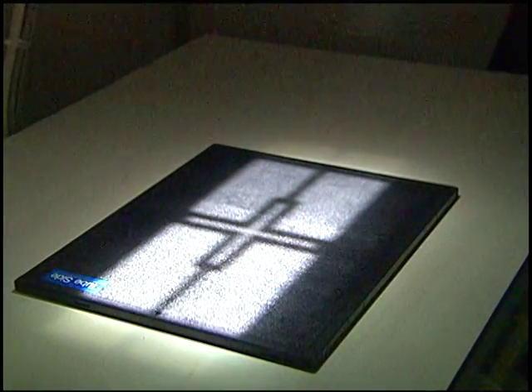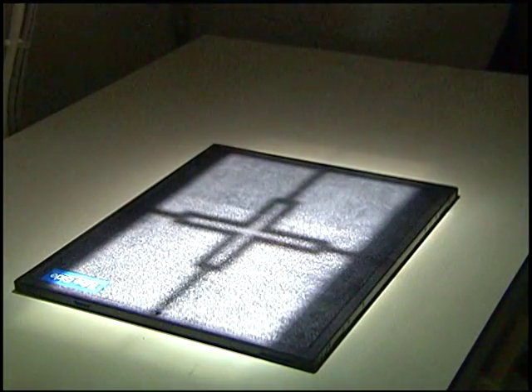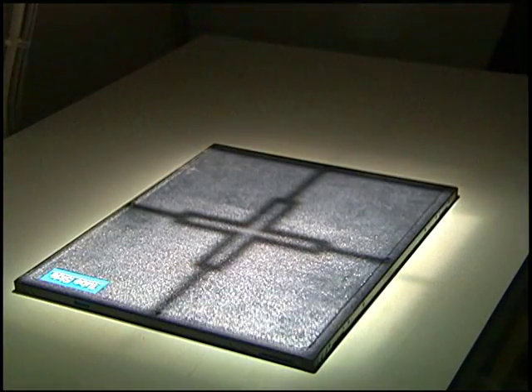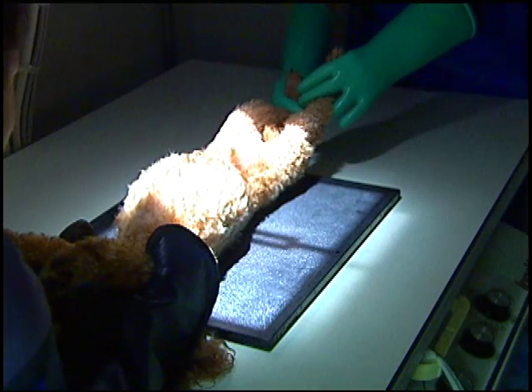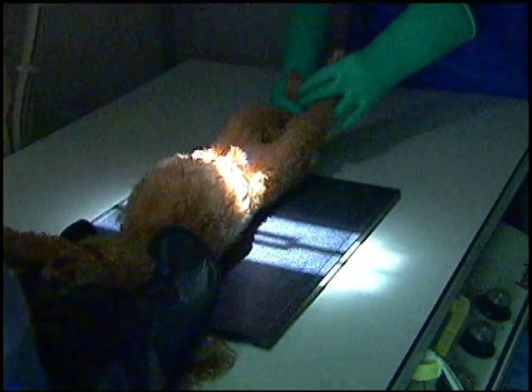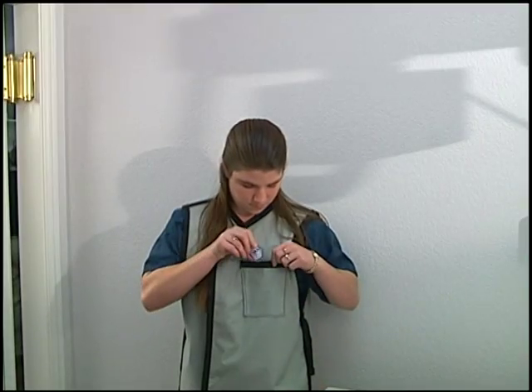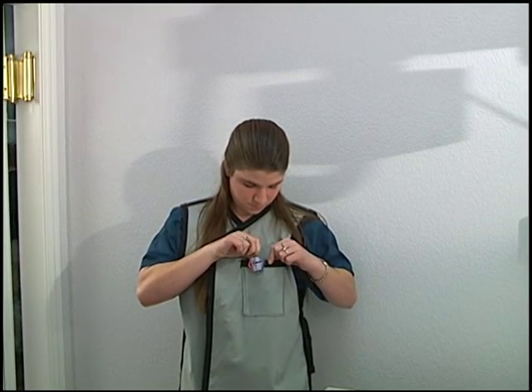A special device called a collimator is attached to the X-ray tube that limits the X-ray beam to a very limited, defined area. This collimator is adjustable to accommodate various film sizes and animal sizes. It is always to our advantage to adjust the collimator to achieve the smallest beam possible for what we are attempting to X-ray.